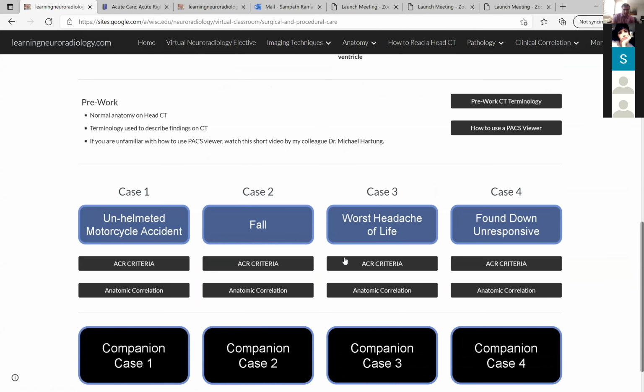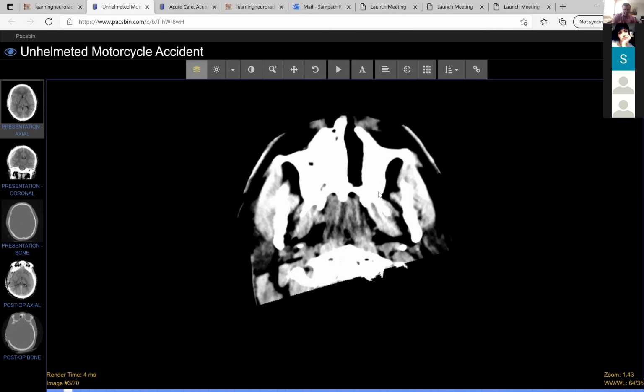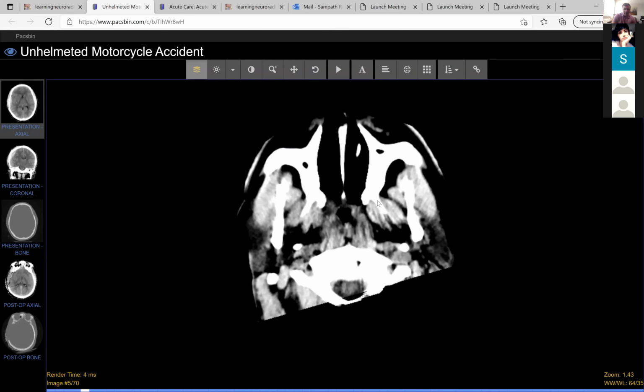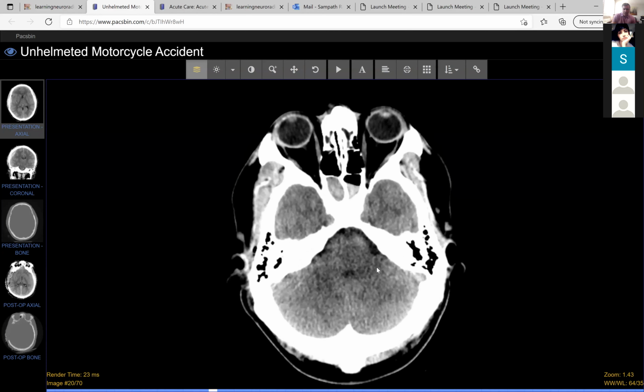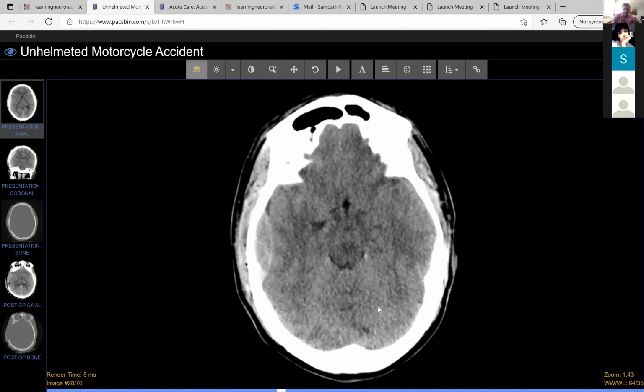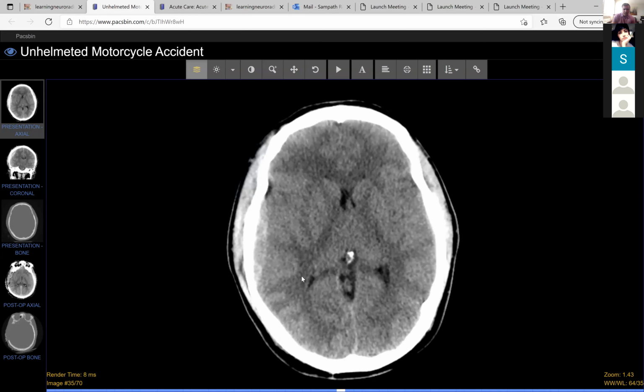So here are some cases which we see a lot in PR. It's summertime here, so people drive a lot on their bikes, and we see this a lot. Okay, so I just want to show you this one. This patient, obviously, had a big accident on the motorcycle, and as you can see, I showed you the same case before.